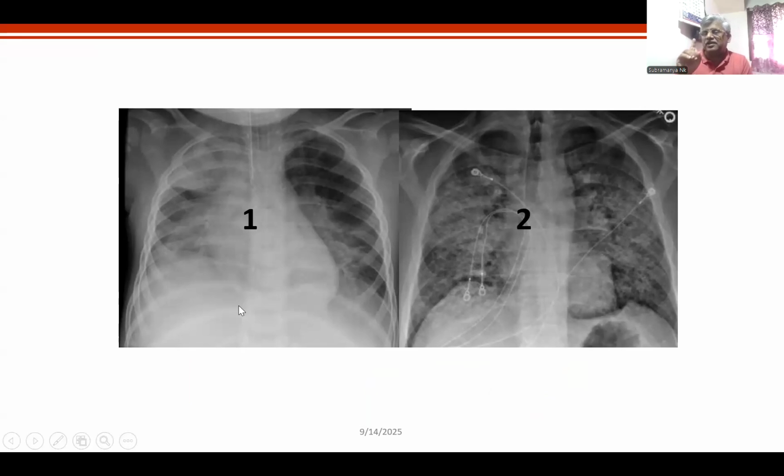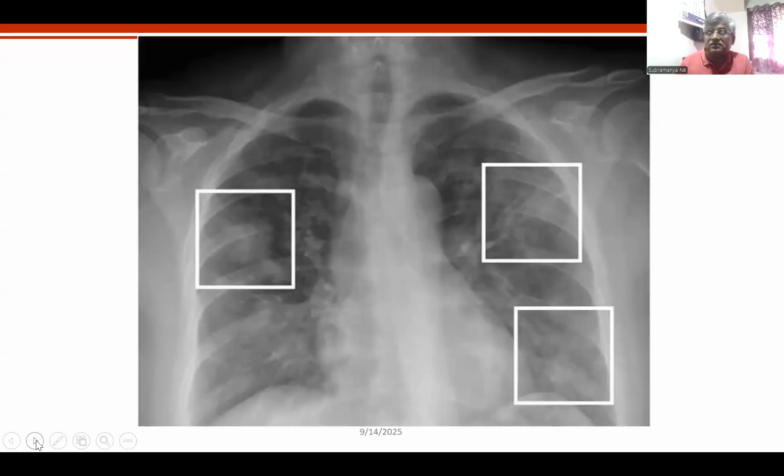Remember all these right upper lobe, right middle lobe, I showed you are all alveolar shadows. They were not interstitial shadows. Now I am coming to the area of interstitial shadows, and why they are interstitial also you are understanding, my dear friends. I'll go further. That round, what you see is alveolar. The second round is interstitial.